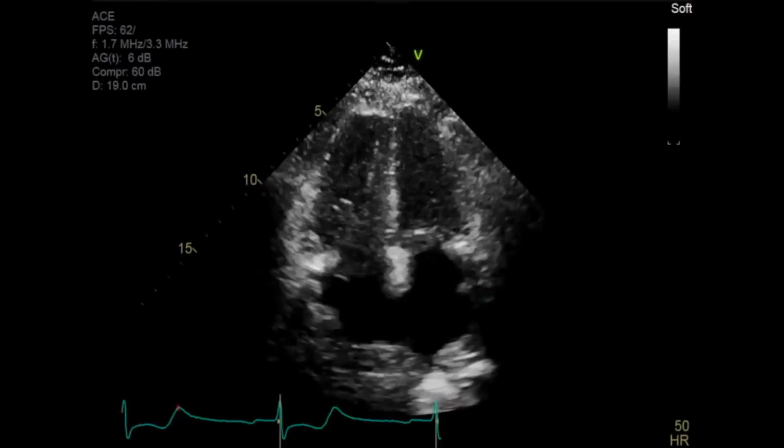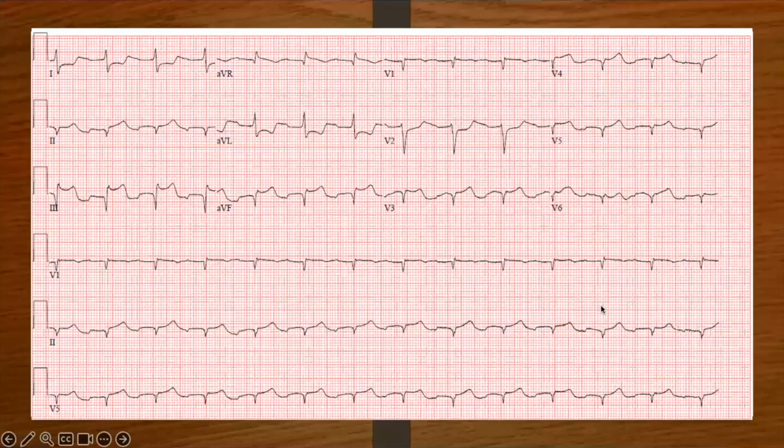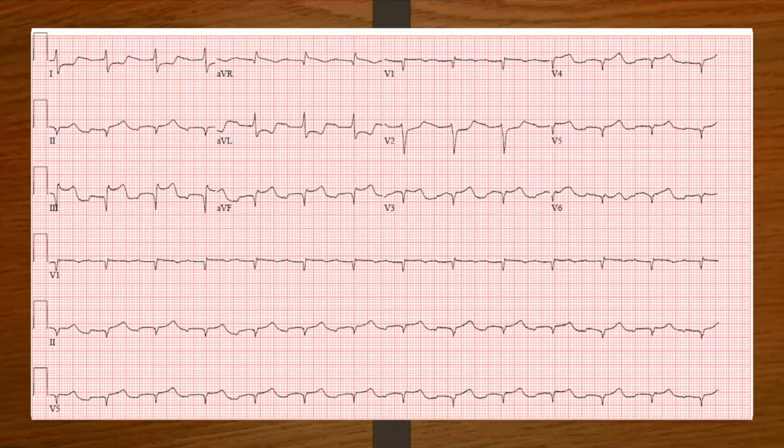In addition, there is a concern about focusing on optimizing the RV. In the parasternal short axis, we sometimes just zoom in on the LV for the RV. So in the first pass, you look for a dilated RV or abnormal RV function, always including the short axis as you sweep through the LV. Good point.